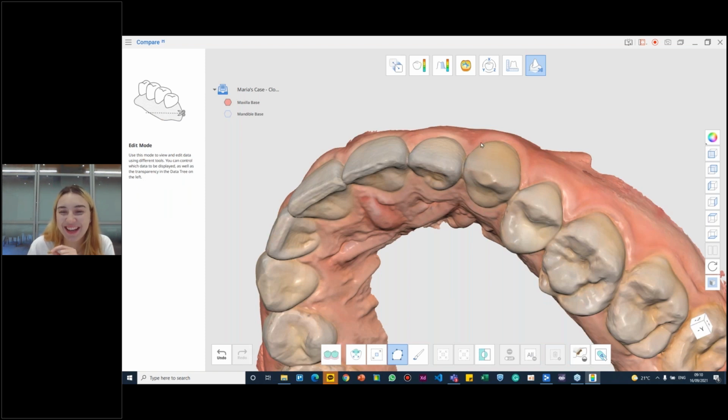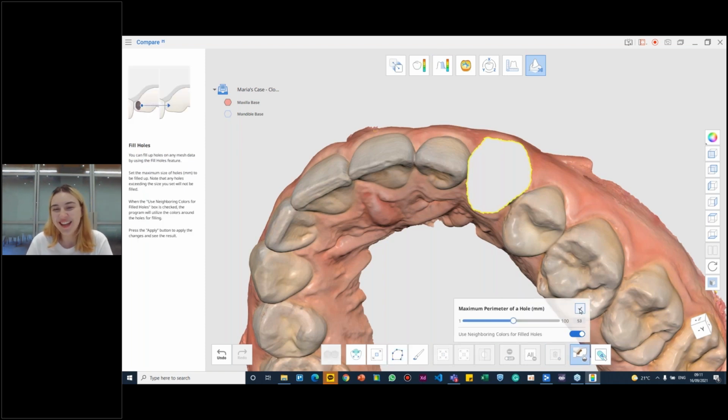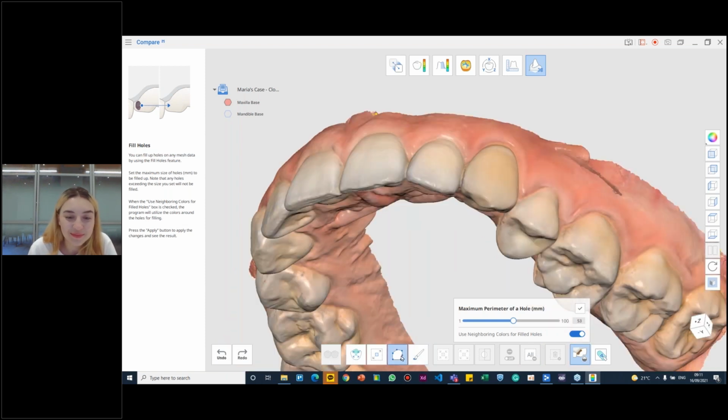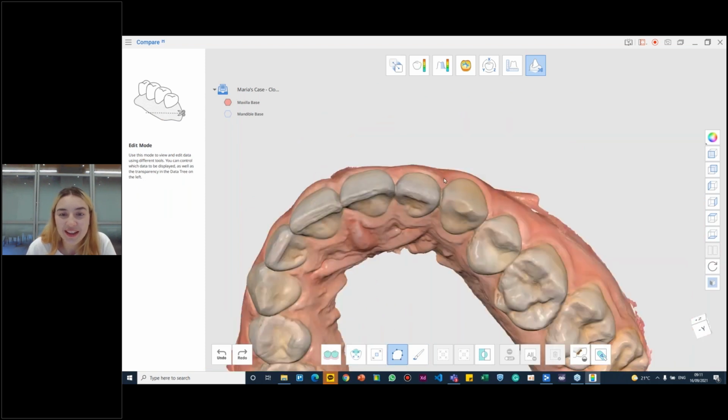It's fine. The more bugs we report, the more we can fix later. It's all helpful to see. Okay, trust me, it worked. Don't worry, it's helpful for everyone to see that not everything works perfectly every single time, but we can move forward with it. If I can do it today, you can do it. Trust me.